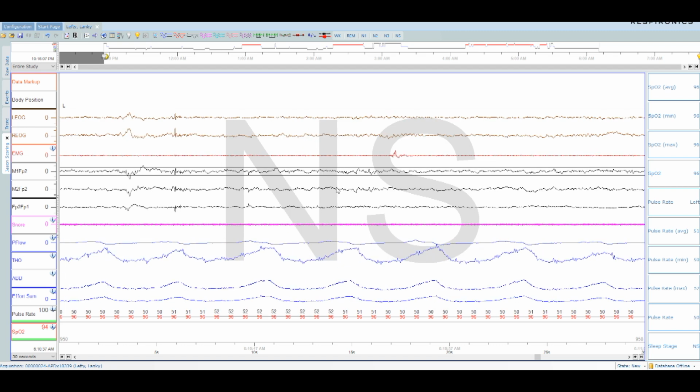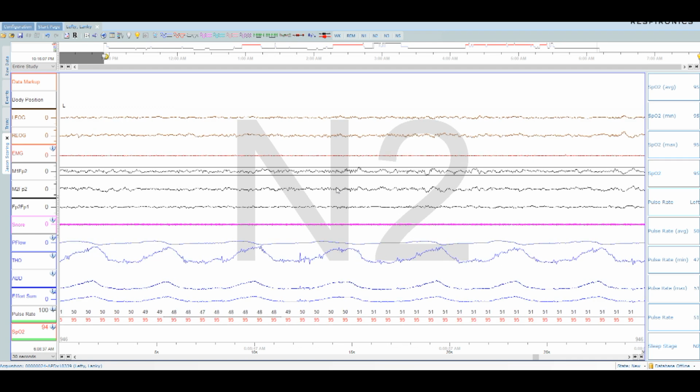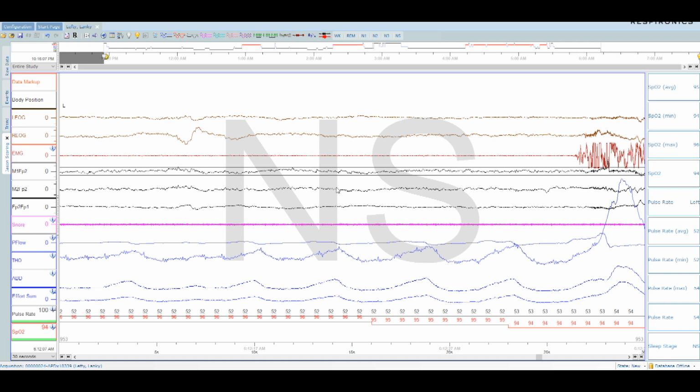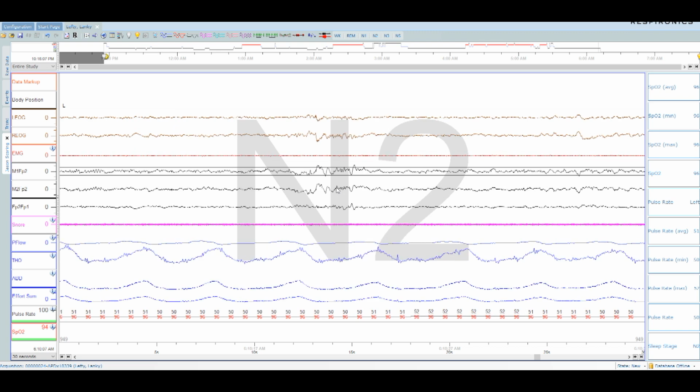That's typically the case. So let's see, we should be having another REM period right here somewhere. I'm expecting it based on the time. And boom, there we go, REM. Actually, I'm going to see, start it.